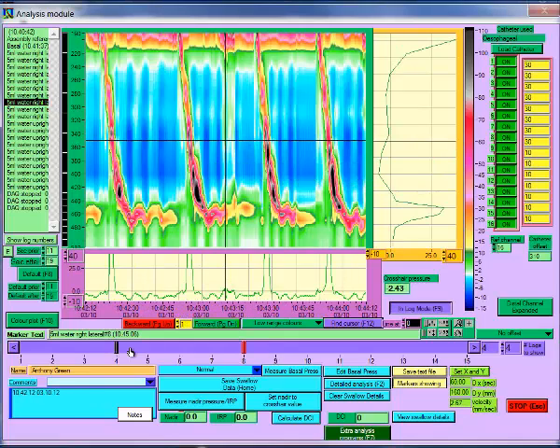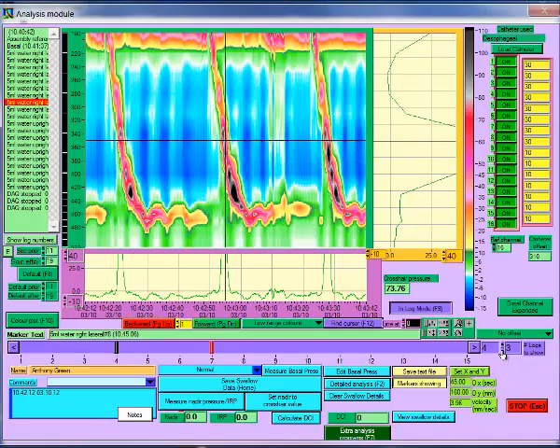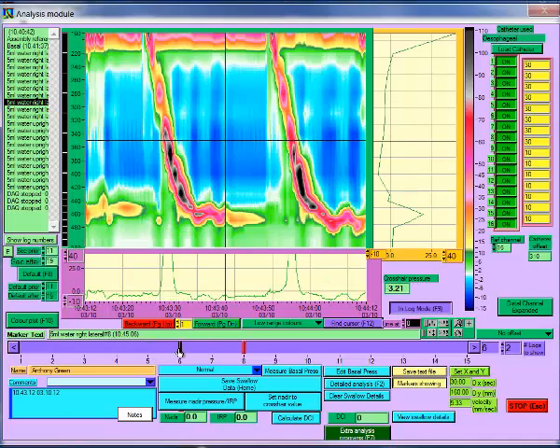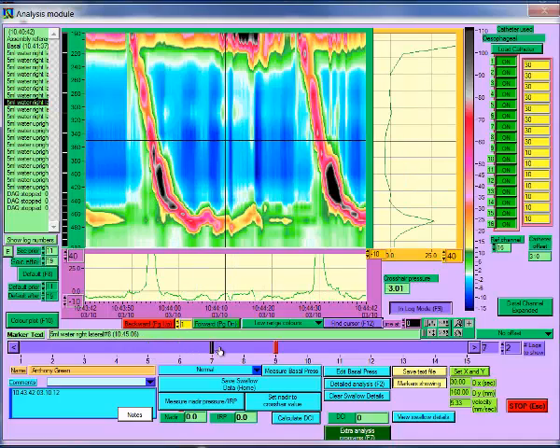The number of the first data log displayed is indicated at the right-hand end of the purple bar, and the number of data logs shown is immediately to the right of that. You can show more or less data by adjusting this control. Move around in the data file by dragging the black marker along the purple bar.